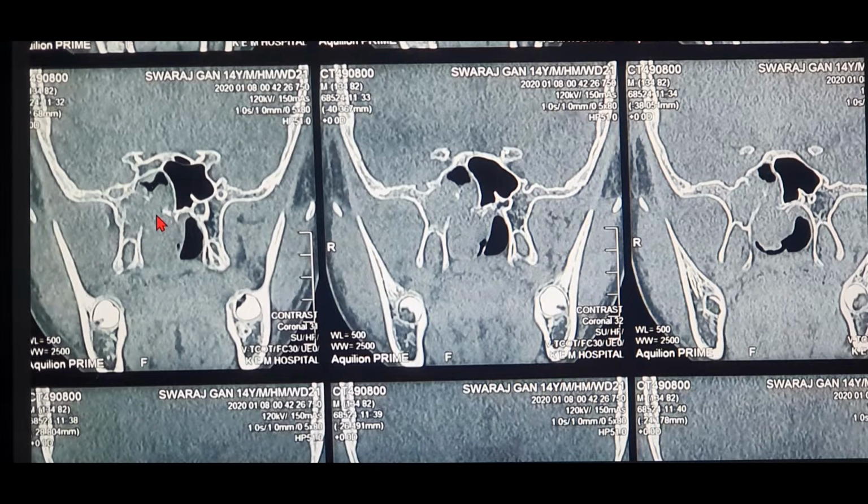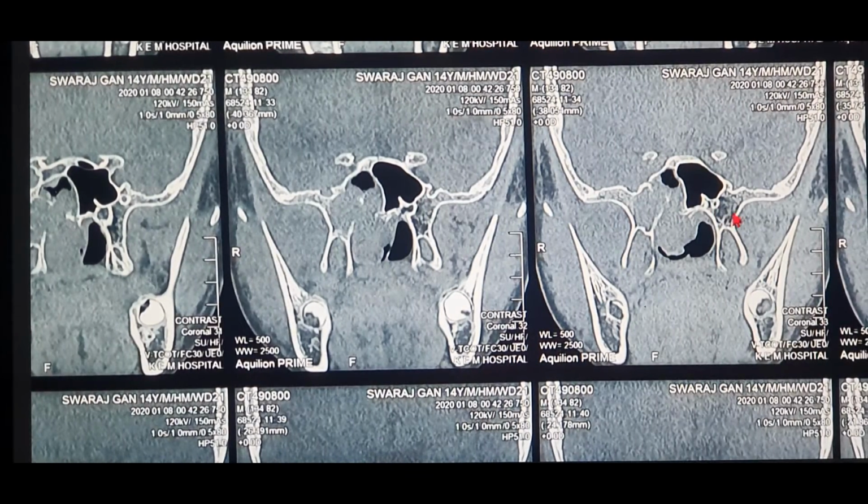So that's one thing. The second thing, as you can see over here, this is the medial pterygoid plate, that's the lateral pterygoid plate, that's the pterygoid wedge, or you can see the pterygoid body. Same thing you can see over here, that's the pterygoid wedge, the pterygoid body. Same thing you can see much more clearly, the pterygoid wedge or the pterygoid body, the medial pterygoid, the lateral pterygoid, and the choana over here, and the left sphenoid, the anterior clinoid, and the posterior clinoid.